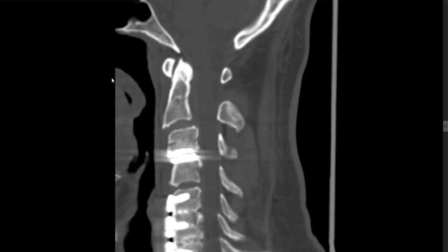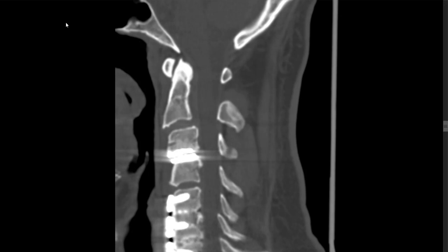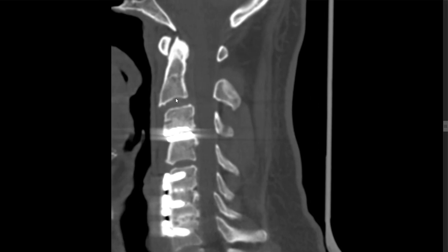This is a study for Daniel L. To review, this is obviously a post-scan that was done on 4/13/2022. It's going to start off with the obvious. So obviously we see here disc replacement at C3-4, skipped C4-5, and ACDF down below. What are the obvious signs of further problems that can cause symptoms?